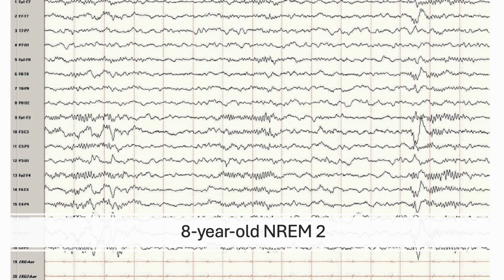The electrodes are linked together, so the big K-complex appears to be upside down. And it is on that side, but we're looking at it through a different camera view when we link it to regular mastoids. But because it's linked to F3 to C3, it's showing the path of the signal.